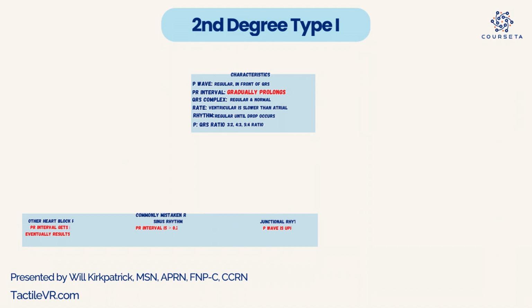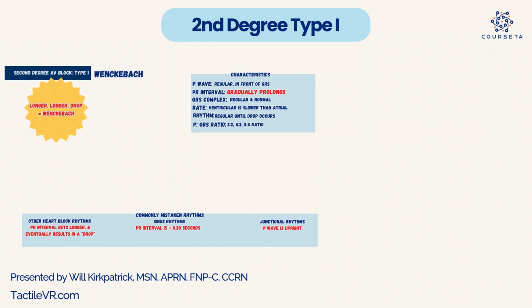All right, so second degree heart block type 1. This is also known as Wenckebach. Now you might know already that a lot of people like to use the mnemonic "longer, longer, longer, drop, Wenckebach." Well, that actually is a very good mnemonic. I'm not a huge fan of a lot of mnemonics, but that is a good mnemonic because it actually tells you what to look out for.